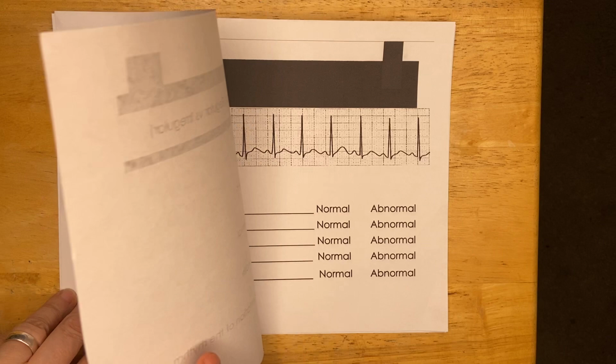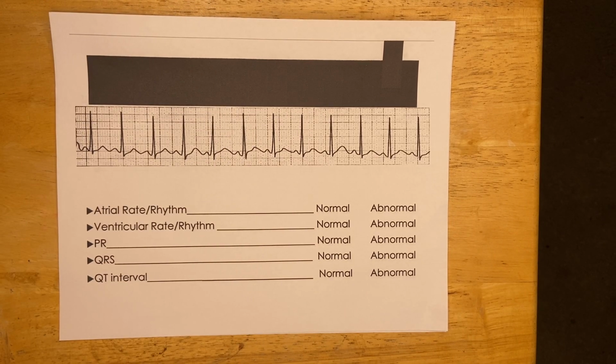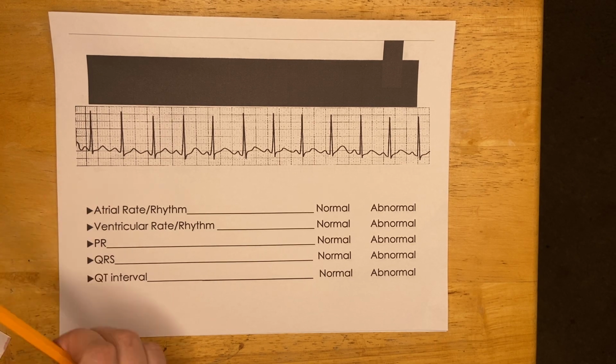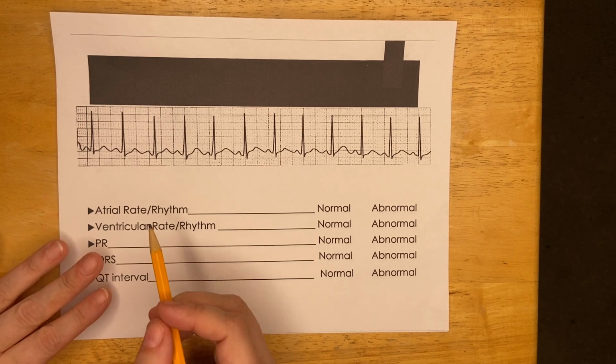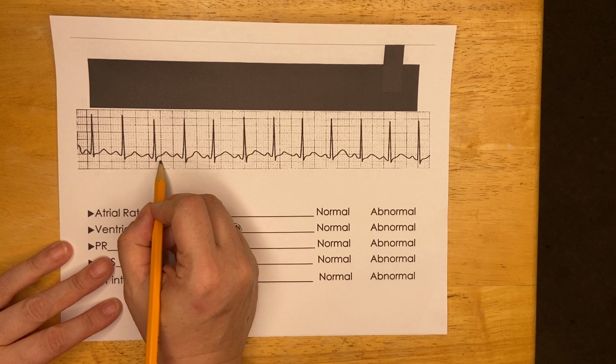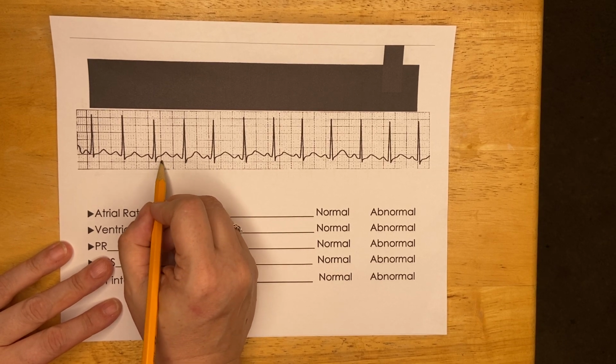Let's do a little bit of practice, and we're going to add even a couple of more measurements to it. So one of the things that I can tell from some of the measurements that I saw is that we are not all following best practices for where to measure our distances. So by way of review, when we are looking at distance here, you can see these big, heavy boxes.